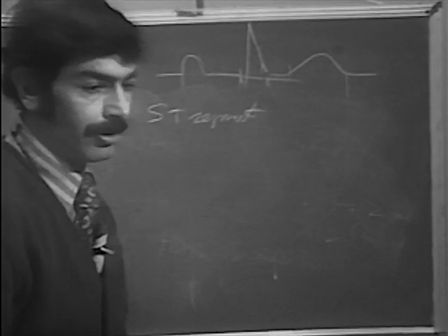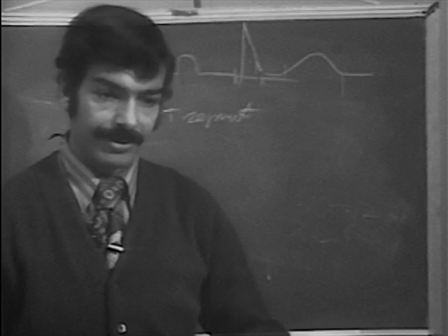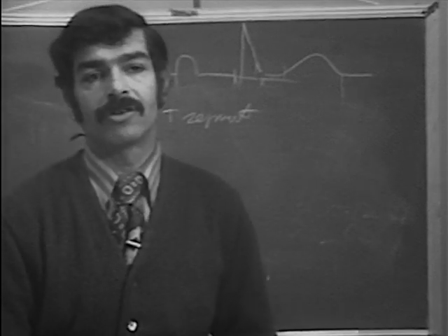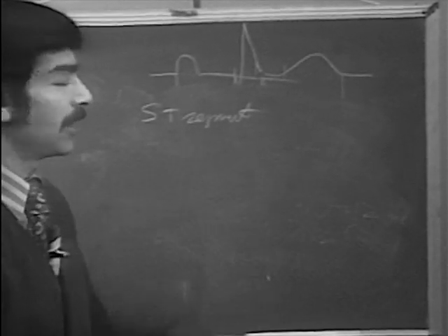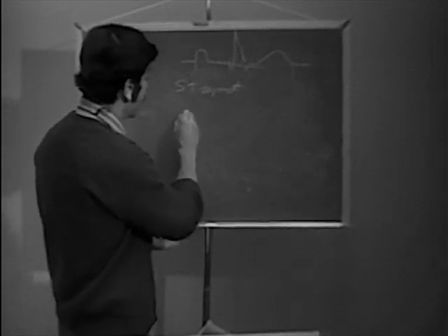And we're not interested in the ST segment in terms of whether it's prolonged or not. We're interested, of course, in whether it's elevated or depressed. So the question is then, what is significant elevation or depression of the ST segment? This depends on the lead that you're looking at. So depression or elevation of the ST segment in the frontal plane leads.